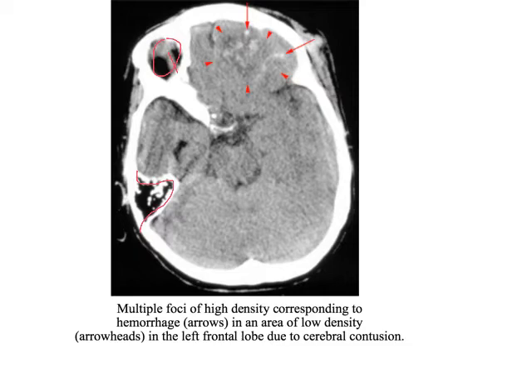Nevertheless, this is perhaps the best the tech could do given the considerations, but for our purposes what we're looking at are these different little areas of high density where we've almost got like a bruise or laceration injury caused to the brain because the cerebral matter has impacted the left frontal bone.